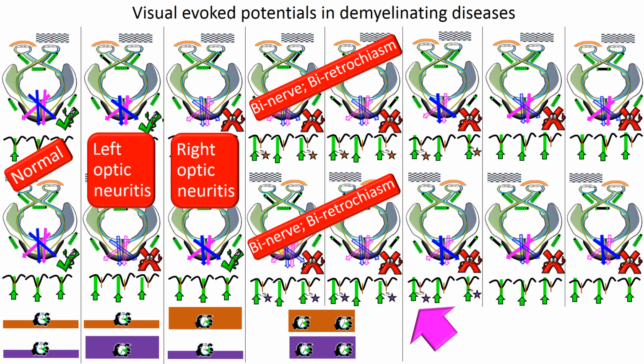You can now look at the arrow so you can compare the two sides. The arrow now is pointing to the left and now to the right. I have represented these findings below the sixth column. Notice that the clock on the left is showing delay, while the ones on the right are not showing any delay.